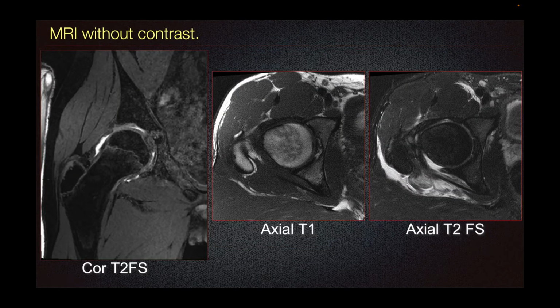The patient in this case underwent MRI follow-up at approximately 4 weeks, which demonstrates some labral tearing. Also, we can see that the ligamentum teres is thickened, likely related to prior injury. Here we can see some associated muscle edema and fluid outside the hip joint capsule, consistent with history of hip dislocation.